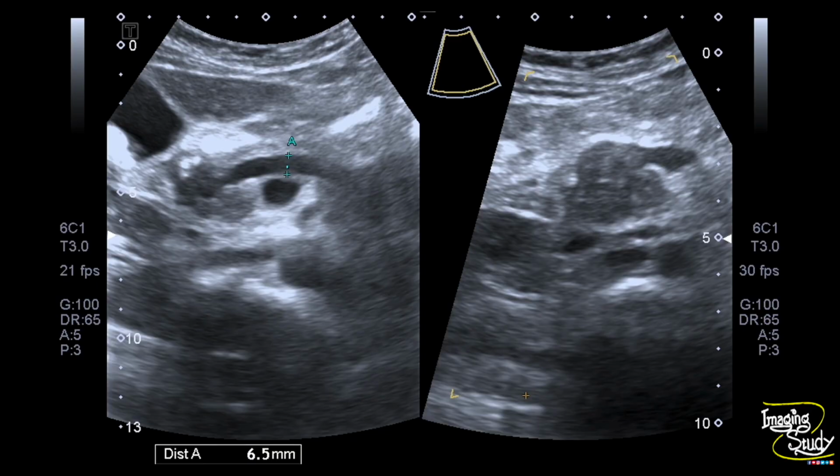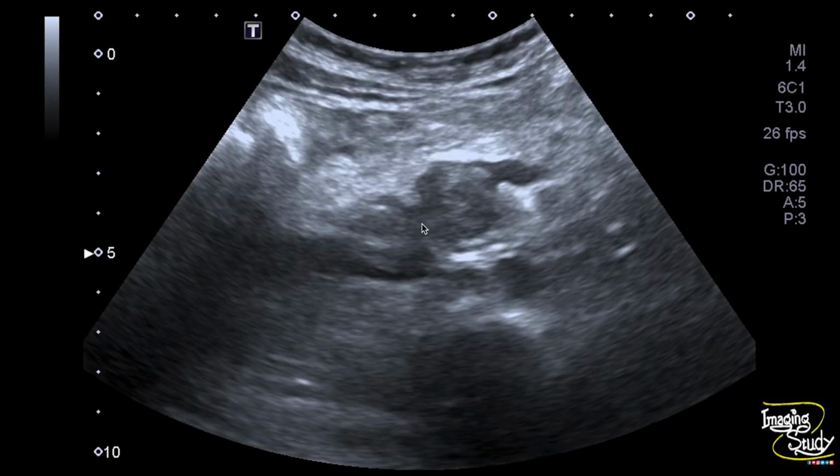Here's the picture and you can see the main pancreatic duct is around 6.5 mm and you can see some tiny hyperechogenic foci at the pancreatic head region indicating parenchymal calcification, and adjacent to it the pancreatic head looks enlarged, lobulated and irregularly hypoechoic mimicking the mass lesion. Here is the hypoechoic mass-like pancreatic head region. You can see some surrounding hyperechogenic thick area indicating the fat stranding.